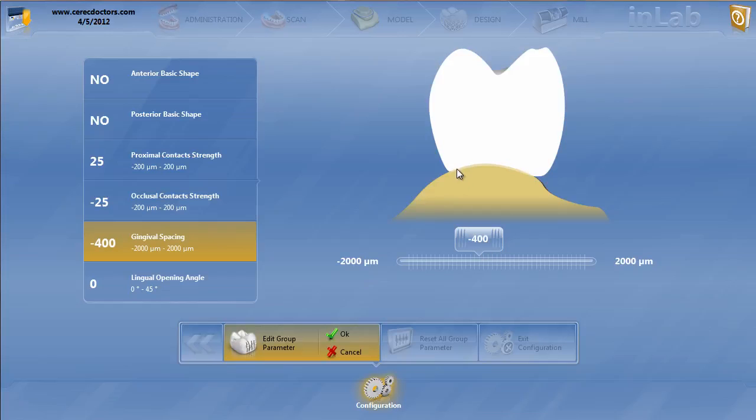The last thing that I want is actually to have a space there, or something that doesn't look like it's emerging from the tissue, having a little ridge. Actually, when we go into bridge design, what I really do is, instead of having a ridge lap type of Pontic, I use my circular shape tool and make that a little bit more ovate. So it's really putting pressure on that tissue for emergence profile and to keep the food out of there.